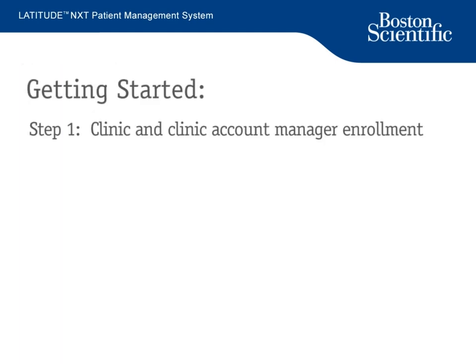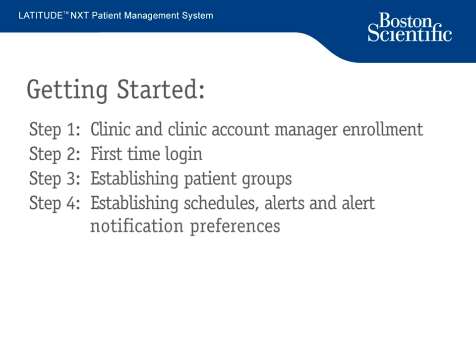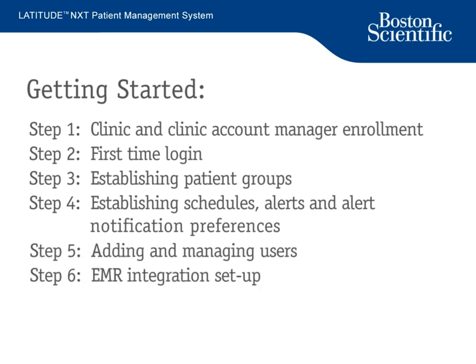1. Clinic and clinic account manager enrollment. 2. First-time login. 3. Establishing patient groups. 4. Establishing schedules, alerts, and alert notification preferences. 5. Adding and managing users. And 6. EMR integration setup.